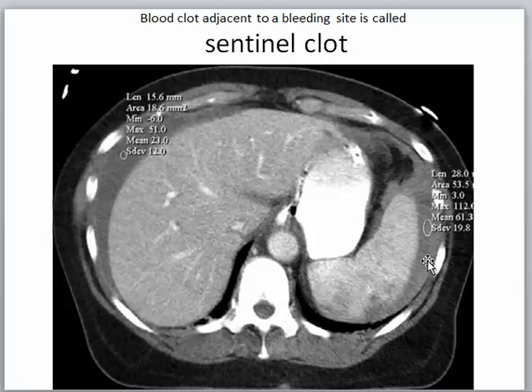The measurements of this collection is higher than the measure of this collection, so that our direction should be to this side. That means that there is an ooze here, there's something oozing and not there, and what is collecting here is the serum, supernatant fluid.